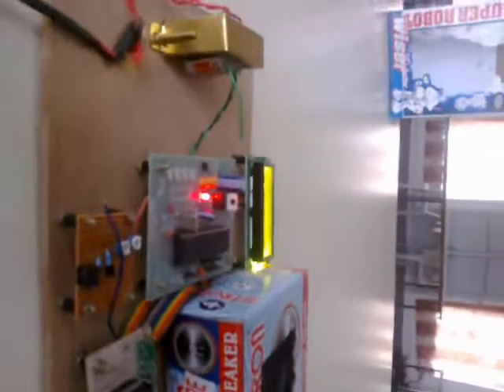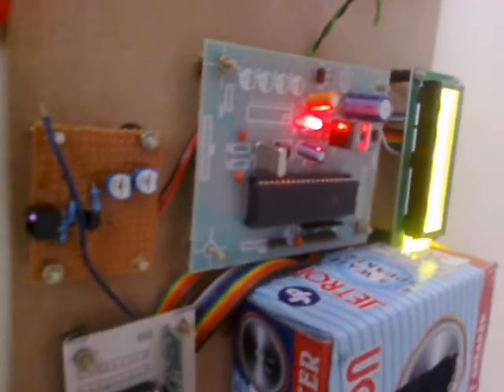Thus, when this person responds to the treatment, and if the particular person next to him is not aware of his movements in the body, there's a loss of information. Thus, when we connect this kit using a transmitter and the sensor section which is placed near the person, and the rest of the kit is placed near the nurse station or the person who is attending the patient.